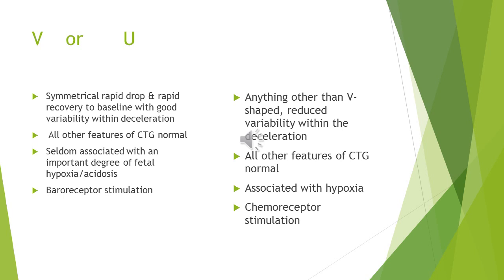But the U is a gradual drop and a gradual return. The U can be either early or late. Late means fetal hypoxia and chemoreceptor stimulation.